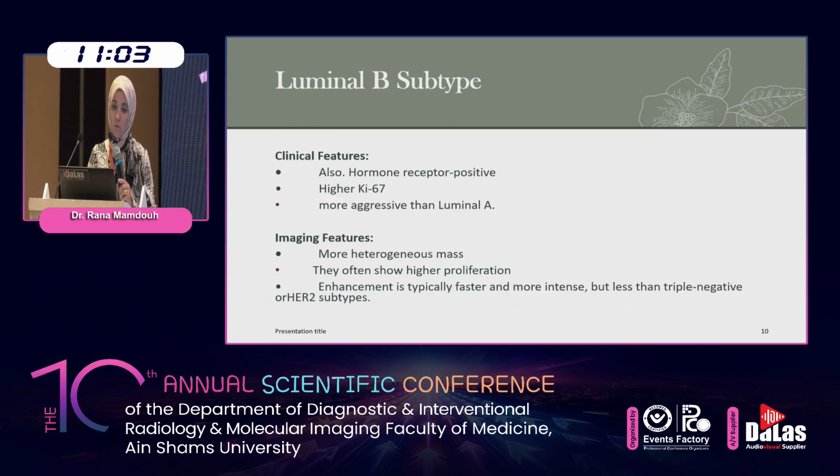Luminal type B is also hormone receptor positive, but it has a higher Ki-67, more aggressive than luminal A. So in imaging, we see a more heterogeneous mass and often higher proliferation. It may have satellite lesions. The enhancement is typically faster than luminal A and more intense, but less than triple negative or HER2 subtypes.